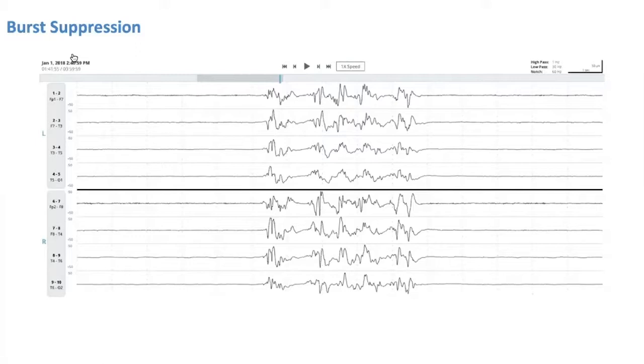How about the opposite for the EEG? How about the depth of burst suppression itself? I usually like to see if I'm looking at 15 seconds or 10 seconds. Here I see 15 seconds, and I see that the burst is 5 seconds of 15. So I say 5 divided by 15, basically 1/3 is burst, 2/3 is suppressed. Is that correct?